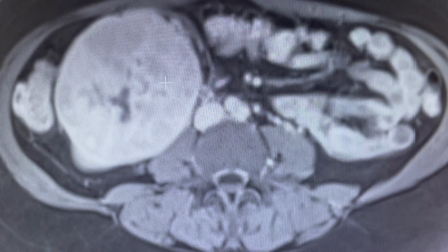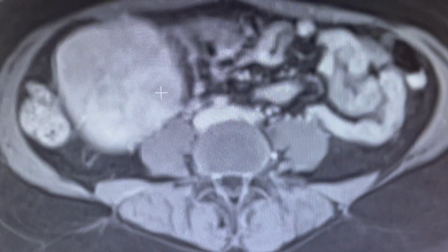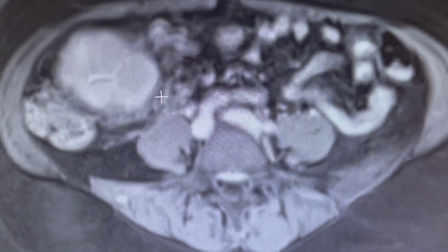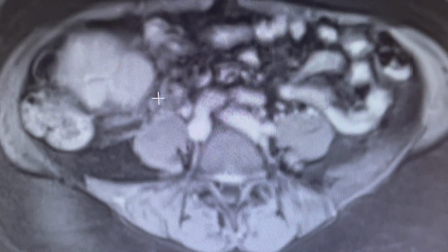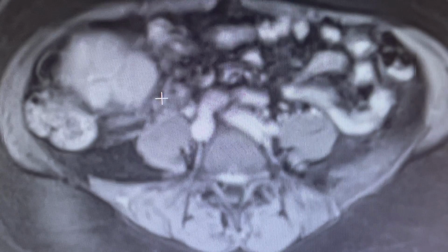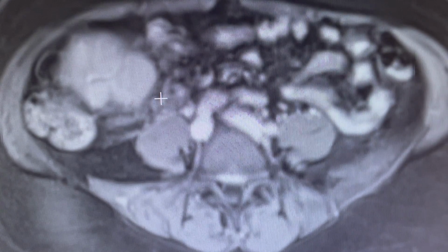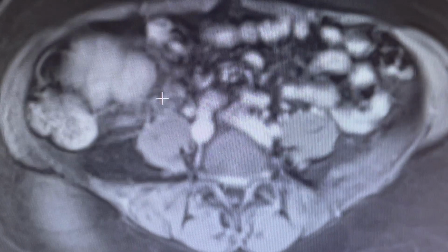So we're going to summarize it this way. The liver lesions show high signal intensity on T2, the larger ones; the smaller ones are isointense. There's increased arterial enhancement of the lesions, and the small lesions fade to isointensity, while the larger lesions retain contrast.